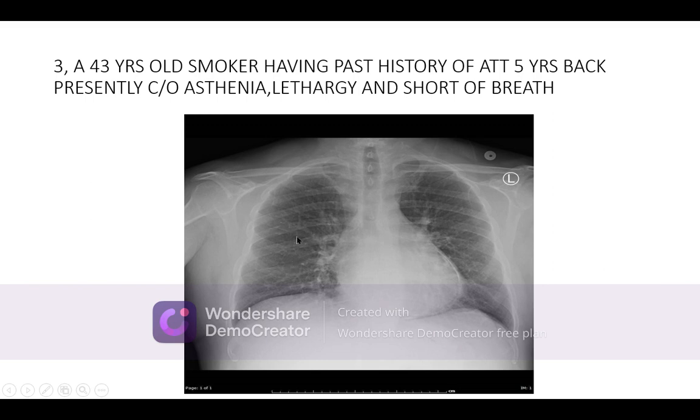And clinically it was also clear. I remember that this case was associated with engorged veins in the neck. About the lower part of the middle mediastinum, the heart and the membranes look like this: this line of the border. That border is a linear calcification, and the base is linear calcification.